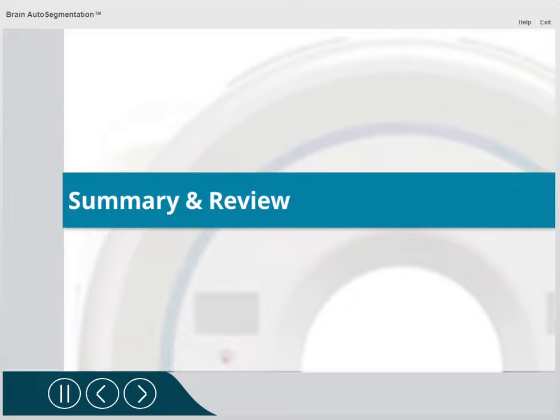Having completed this e-learning, hopefully you feel very well informed on the options and benefits of the Brain AutoSegmentation application. You have observed the complete workflow for generating numerous normal brain structures in a few easy steps, in approximately 3 minutes' time. By now, your familiarity with contouring tools within the precision system will prepare you to make any desired or necessary edits to the VOIs that have been generated. We hope this e-learning has prepared you to utilize this highly specialized functionality. More importantly, we hope you recognize the benefits of choosing to utilize this feature.